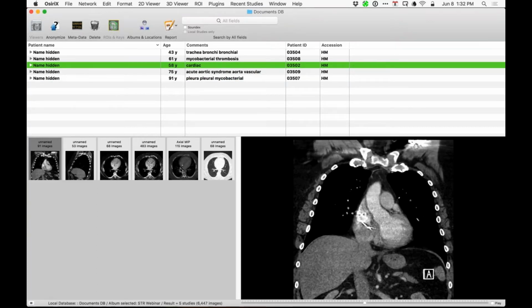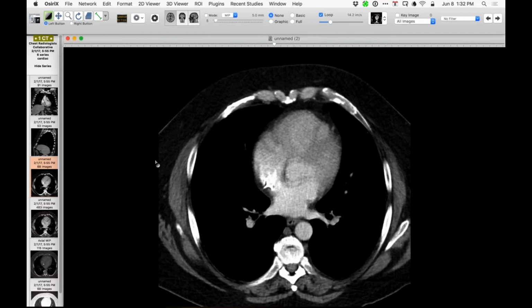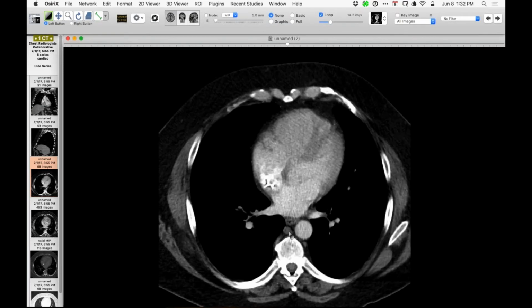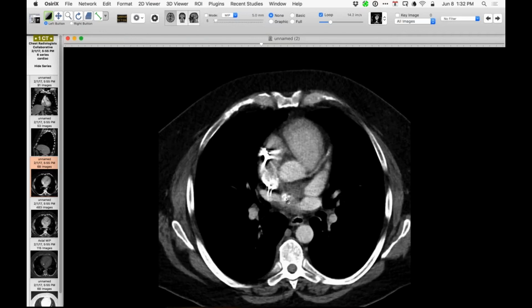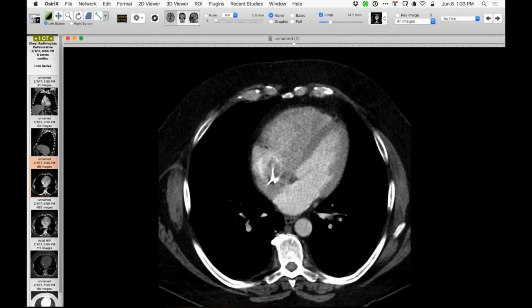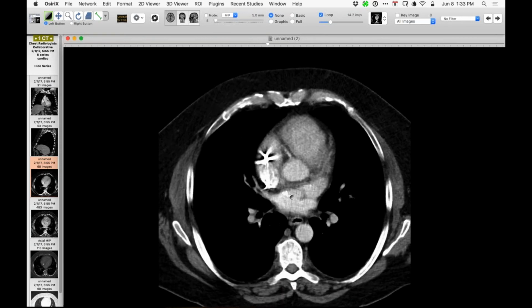This is just a quick case. I'm not sure if I've seen this before, but there's a little calcium here on the endocardial surface of the left atrium right there. And there was another tiny focus in the superior portion of the left atrium right there. And when I got a history of several RF ablations for atrial fibrillation, I thought that's an easy correlation to make. So I'm not sure if I've seen it before or heard of it before.